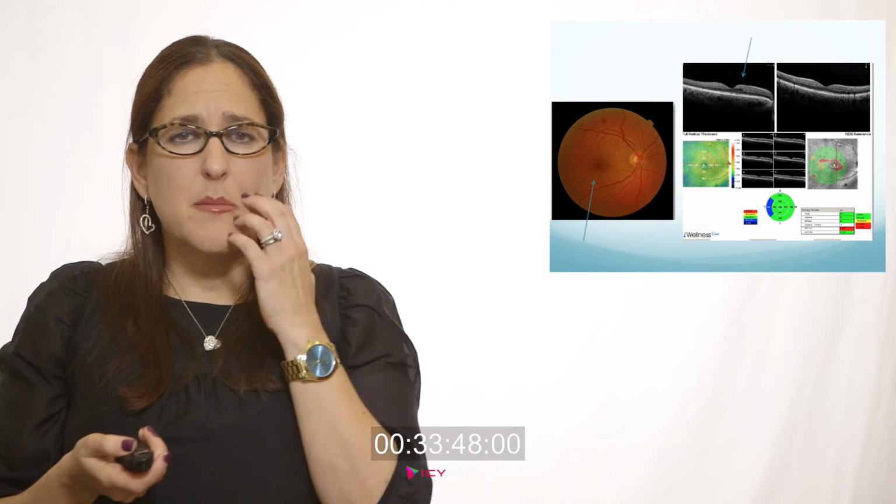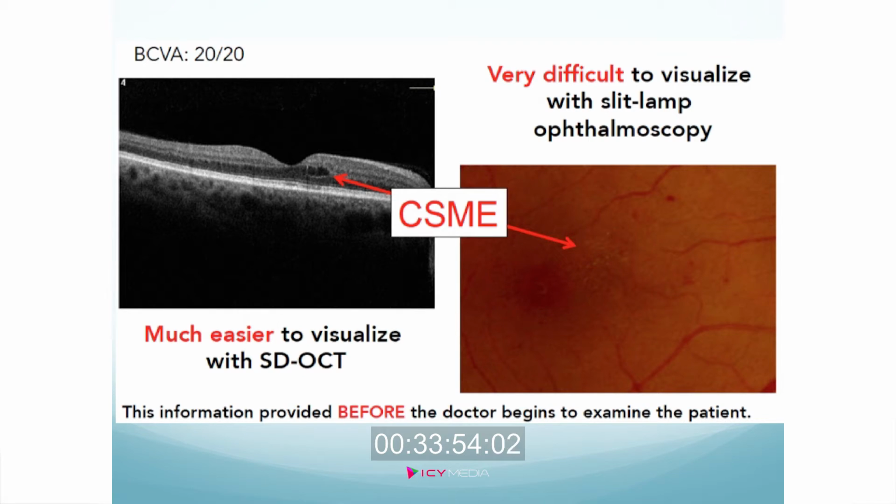And you can see on this image here, the GCC is not perfectly normal because that inner retinal tissue is not perfectly normal, okay? Here we got a higher definition scan, and you can clearly see that the patient has clinically significant macular edema. They have a pocket of fluid right at that foveal space that may or may not have correlated with how well you can see fundoscopically.